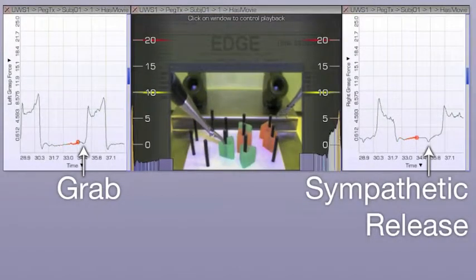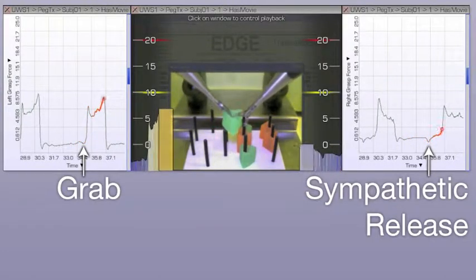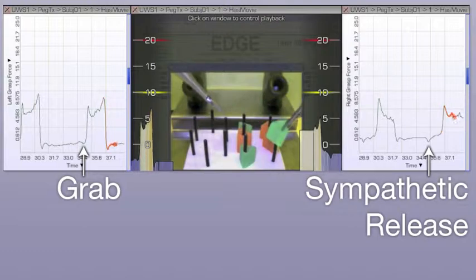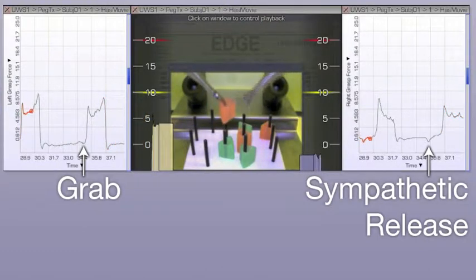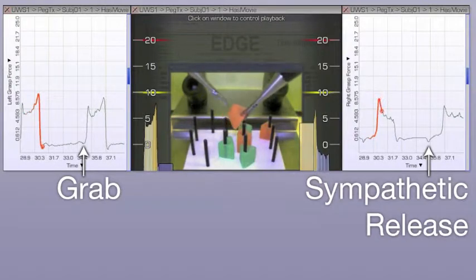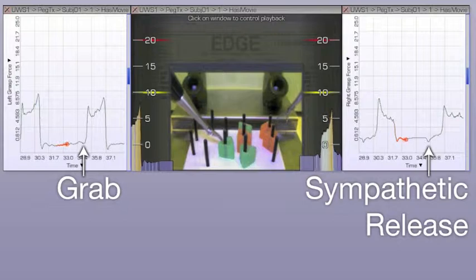One new trend in the use of force that we have discovered using this tool is a pattern we call sympathetic grasp release. At the instant when one tool grasps a block, the other tool often shows a release, even when this tool is not involved in the current action. More testing is needed to learn how to best interpret and take advantage of this pattern in the data.